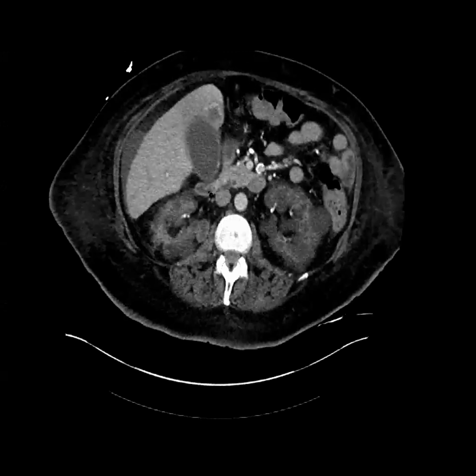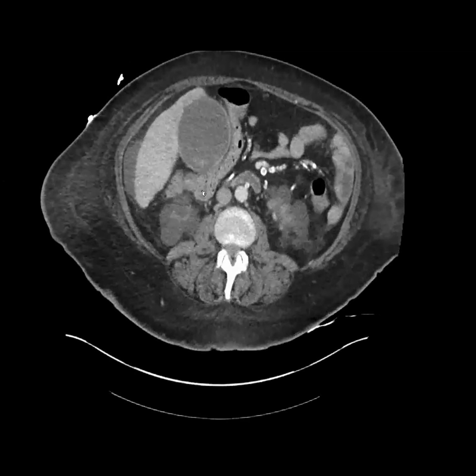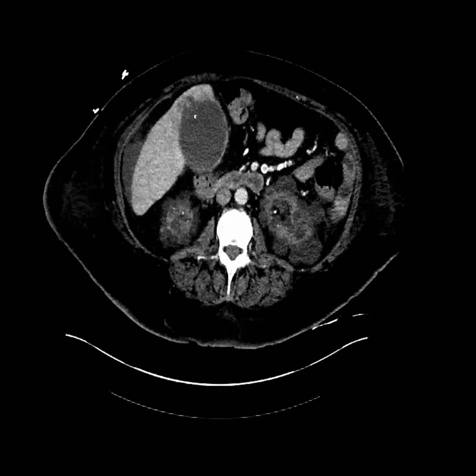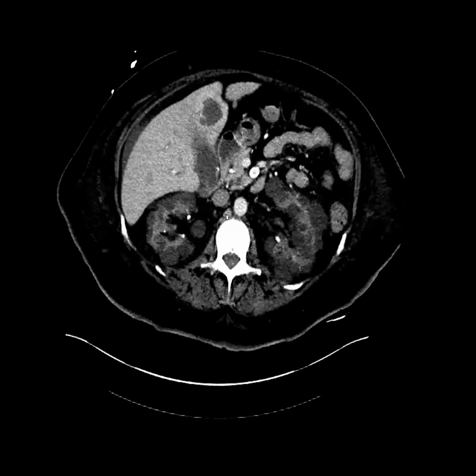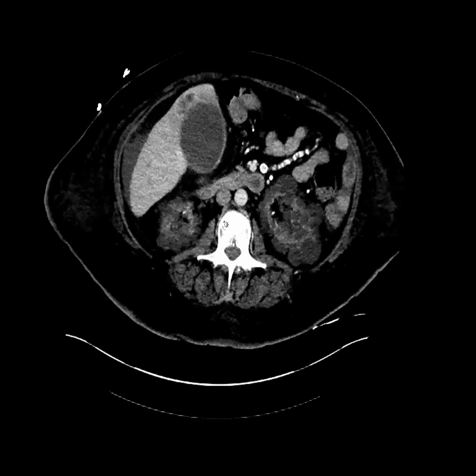They did not do anything. This patient was an inpatient, had multiple other issues. And you can see now that that area that was bulging has actually perforated into the liver. And so we've got some contained bilomas in the liver that was not there 1 week prior. So I thought it was a nice example.